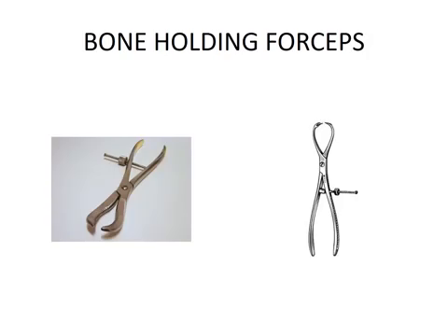Let's talk about some important forceps. The first one being the bone holding forceps. When you have a bone holding forceps, it has threads in it. These are the threads which will help you to hold the bone. And this was the forceps which was asked in AIIMS May 2017. This is self-retaining bone holding forceps. Self-retaining because this locking mechanism will hold the forceps and hold the bone pieces together for a reduction during the fixation of a bone.